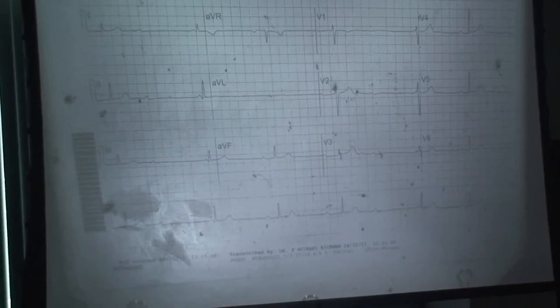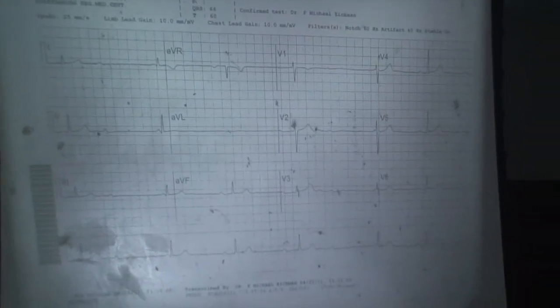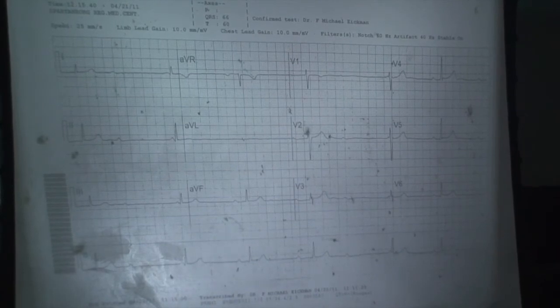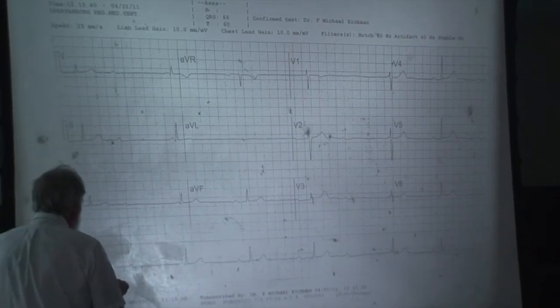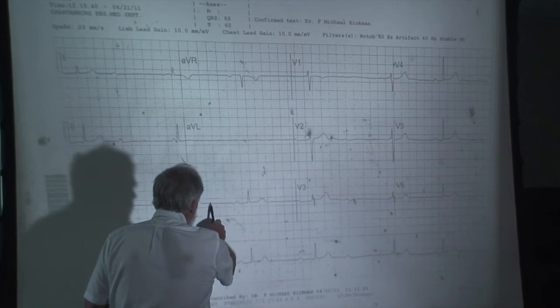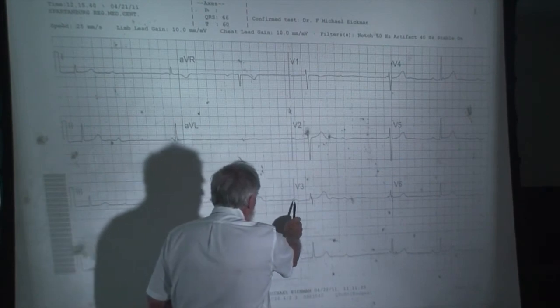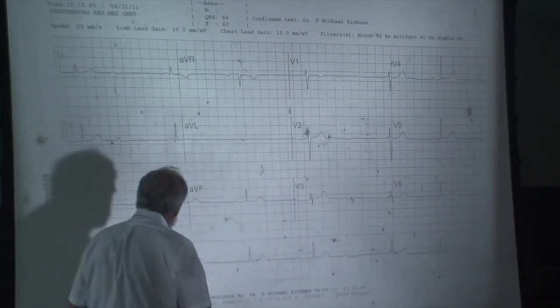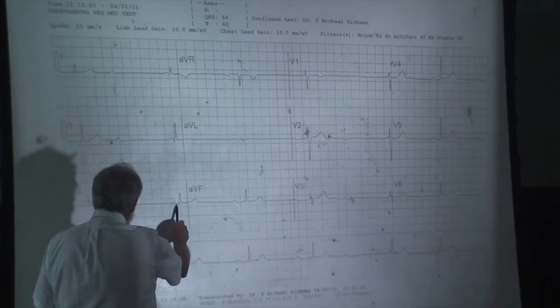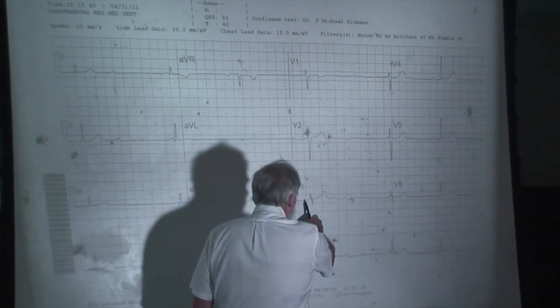There is no question that none of those P waves are conducted. P wave, P wave. There's one here somewhere, P wave. Probably in here, P wave. PR interval very short, PR interval longer, PR interval longer.